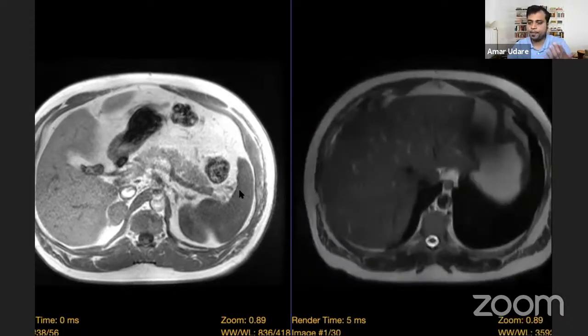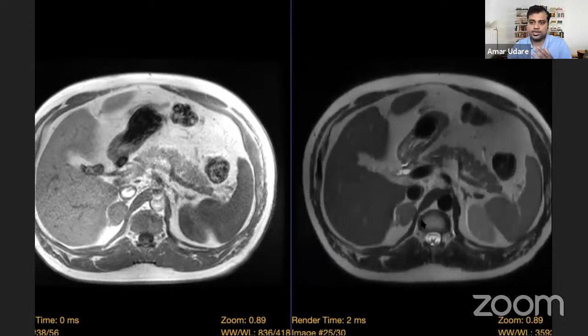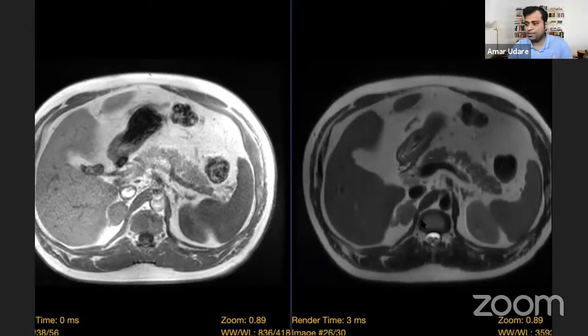In malignant cases, the T2 appearance is more heterogeneous. So this is the T2 study, and look at the T2 appearance, it's quite homogeneous. If this was a metastasis, because inherently Mets are very aggressive, they'll undergo necrosis, hemorrhage, so the T2 appearance would be very characteristic. It'll be more heterogeneous than this.